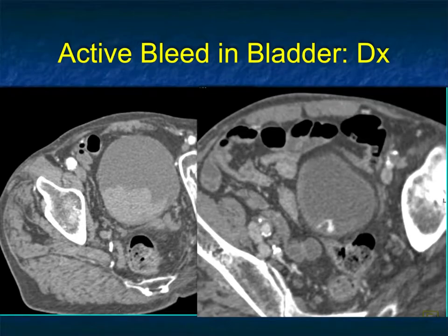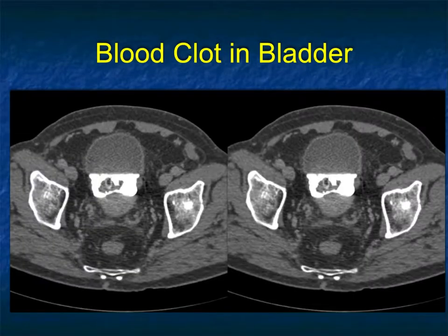Looks very much like we would talk about the stomach with the GI bleed or the bowel with the GI bleed. There's high density material behind. So if you don't see the bleed right away, but you see high density material, you better try to figure out, is it a bladder lesion or something coming from the ureter, perhaps coming from the kidney.